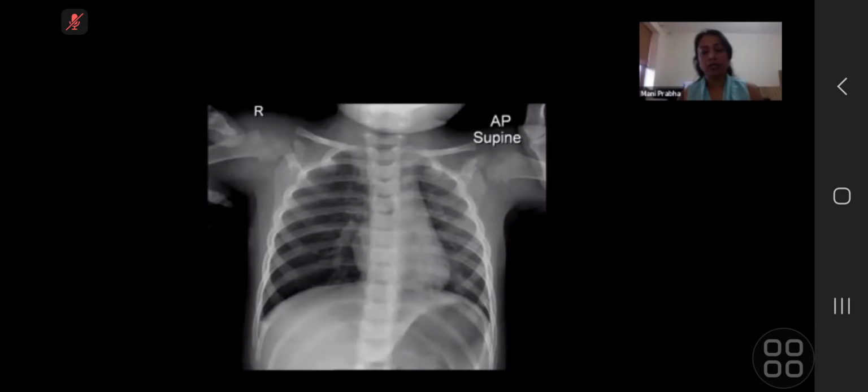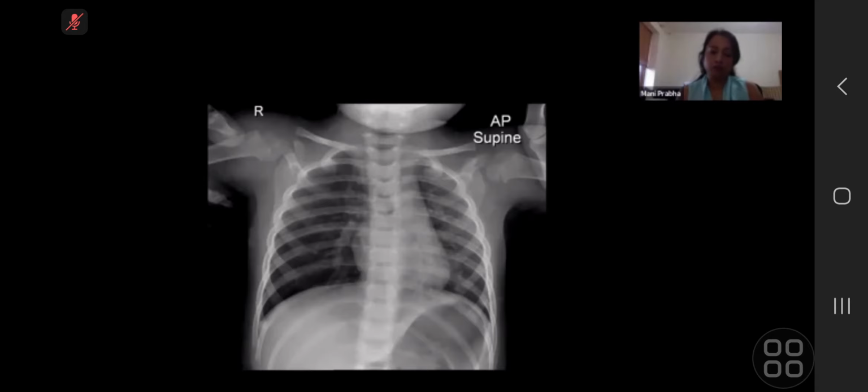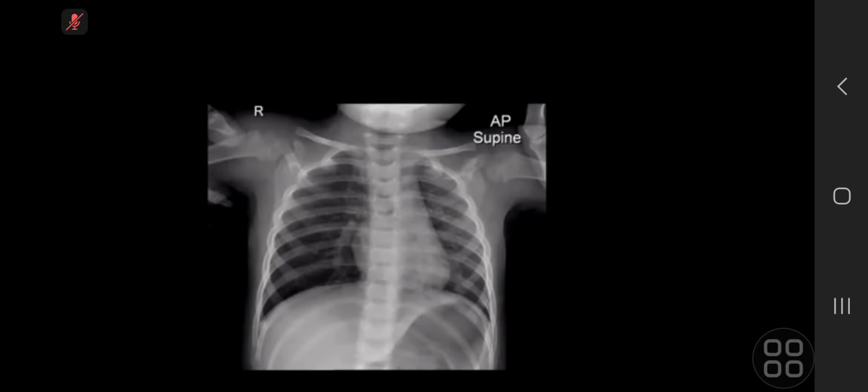Okay, next patient, next case. Okay, so I'm going to comment on the findings later on once I've done with all the cases.